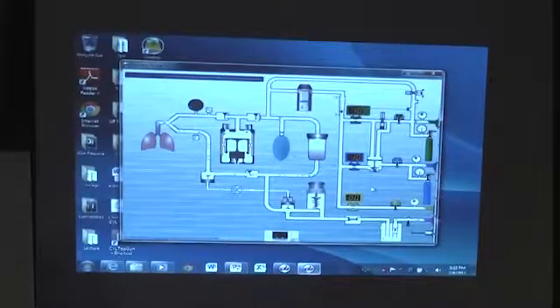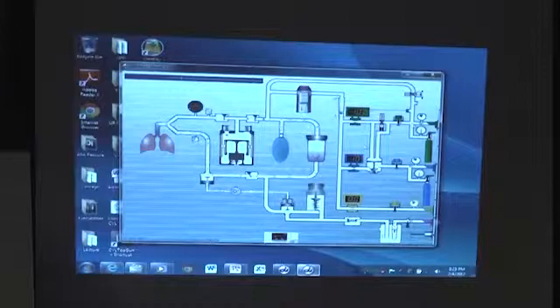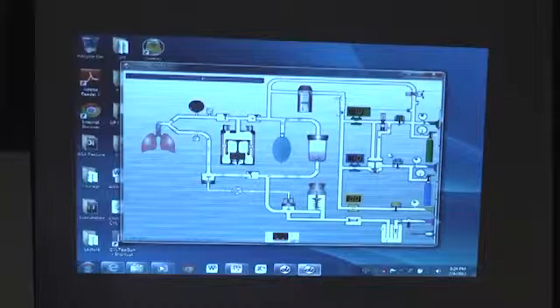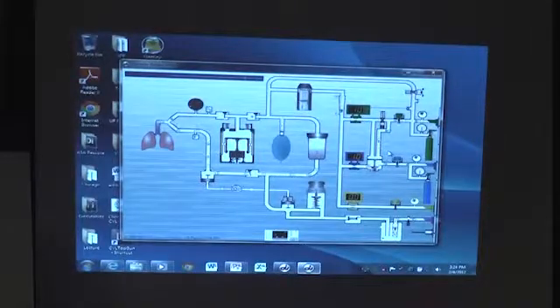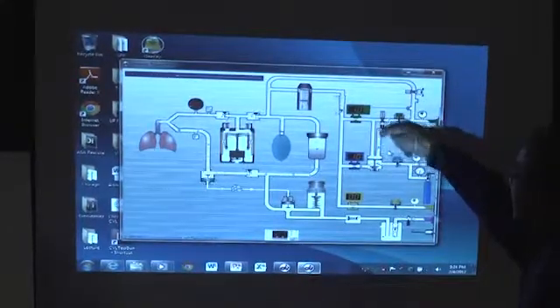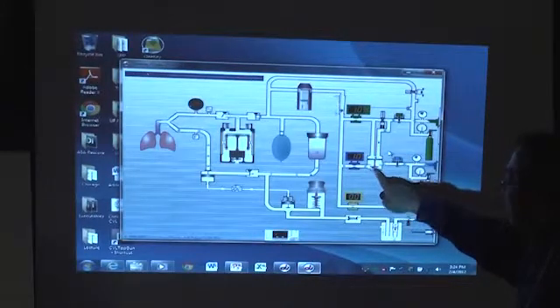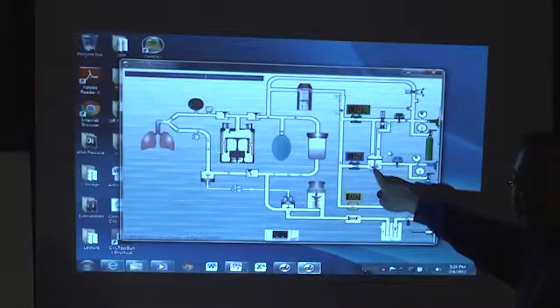Okay, in the piston ventilator, I don't have the simulation where the gas changes, but you'll have to use your imagination. This is where the fail-safe and the ORC is. So how does the ORC work? You can see how when there's gas flow of oxygen, it pushes on this diaphragm. This diaphragm can float, and you can see also there's a spring that's being compressed.